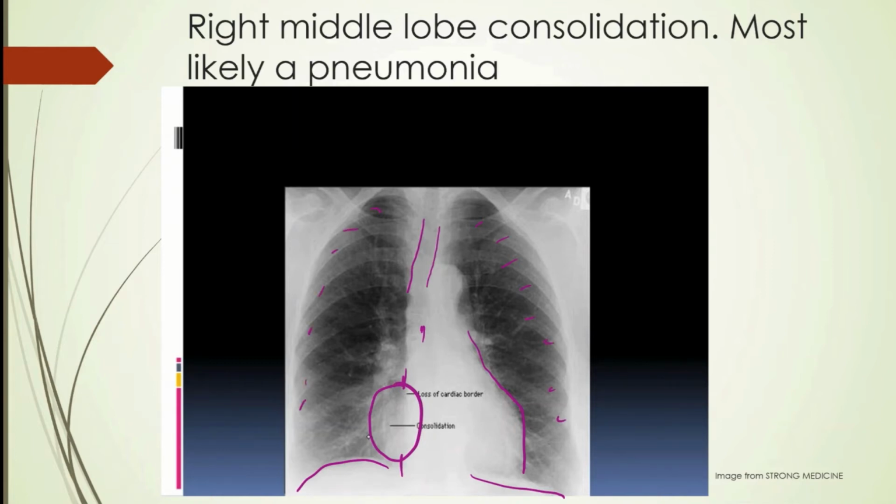So this patient looks like has a right middle lobe pneumonia, and it'd be interesting to see the lateral view as well, but they only give you what looks like the AP view. You can see how the clavicles, even though they're cut off, look to be quite a bit above the lung fields, as well as you don't see a gastric bubble. Of course, part of that's cut off anyway. So yeah, it looks like a right middle lobe pneumonia on this patient.